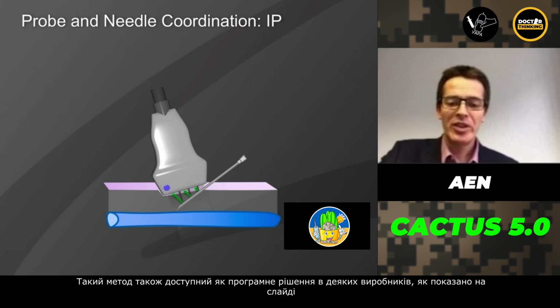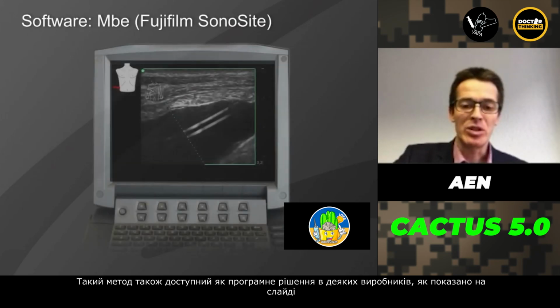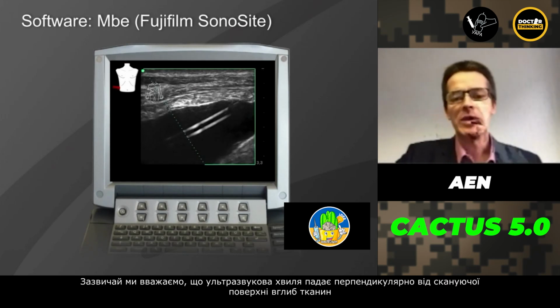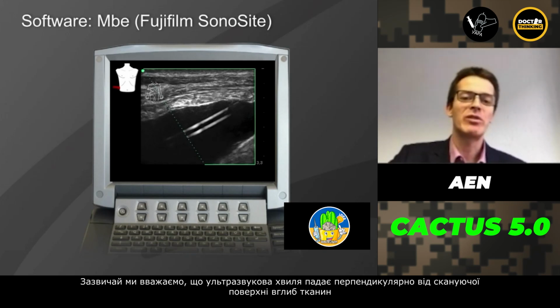And this method is also available as a software solution of some manufacturers, which we see here. Normally we believe that the sound wave travels in a perpendicular direction from the footprint into the tissue.